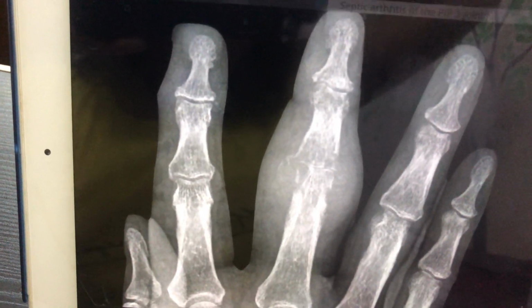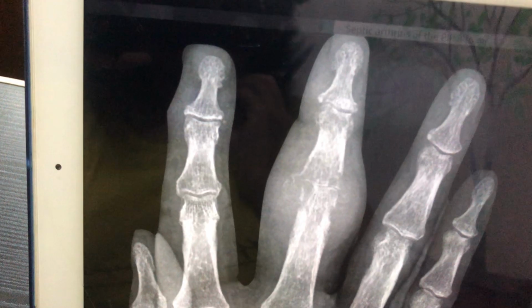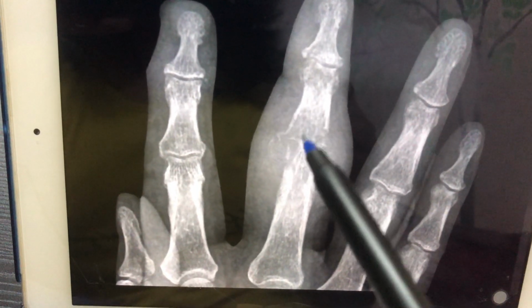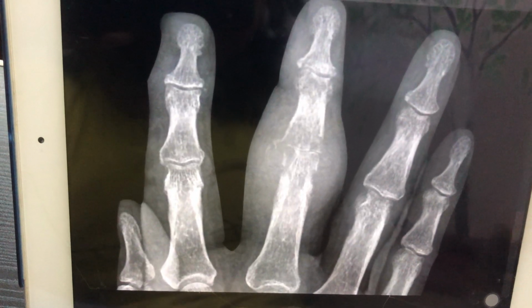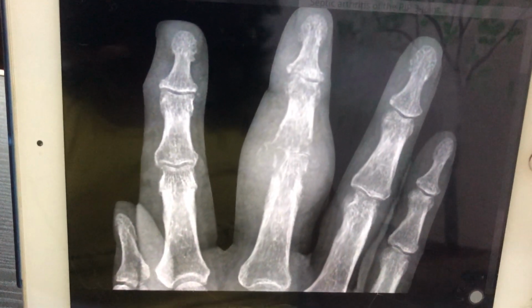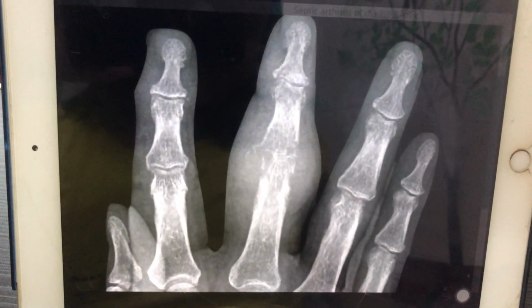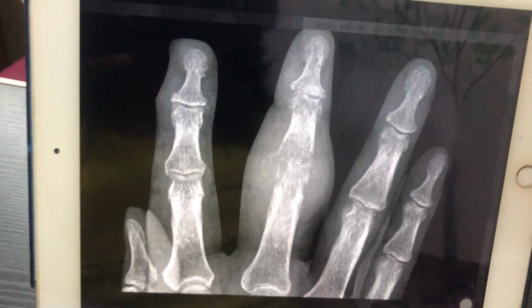There are multiple marginal erosions present in septic arthritis, joint effusion along with thickened synovium. There is juxta-articular osteopenia as well, and symmetric joint space narrowing. The knees are more commonly involved in adults. The knees and hips are involved in children. Apart from that, in the soft tissue, you have synovial microabscesses present.